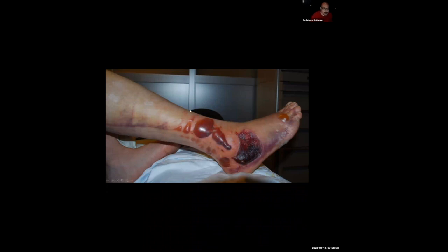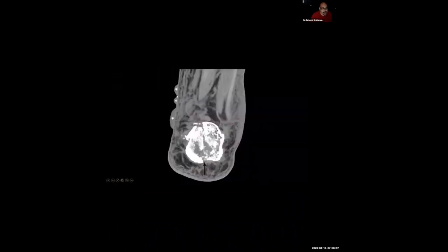Soft tissue blisters are indicative of a severe injury, okay? As you can see here, these serous-filled blisters and these blood-filled blisters are typically going to be readily apparent on clinical exam to our orthopedist, but I do mention them when I see them on the CT here in this calcaneal fracture, because this apparently indicates a higher injury, especially the blood-filled blisters. But as you can imagine, this is also a setup for soft tissue infection, which could complicate management.